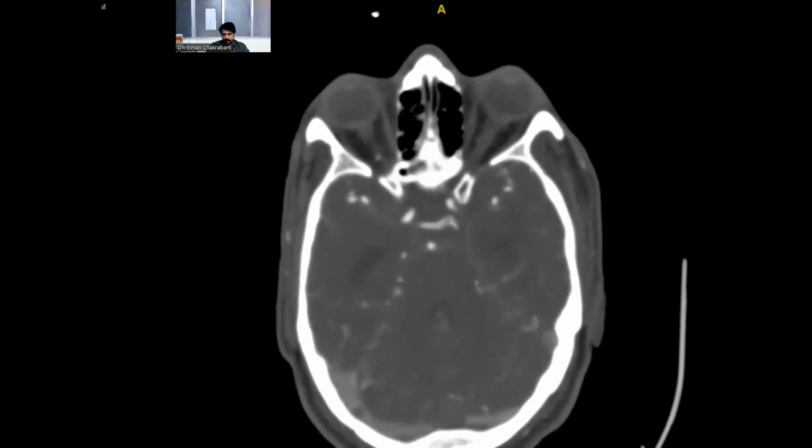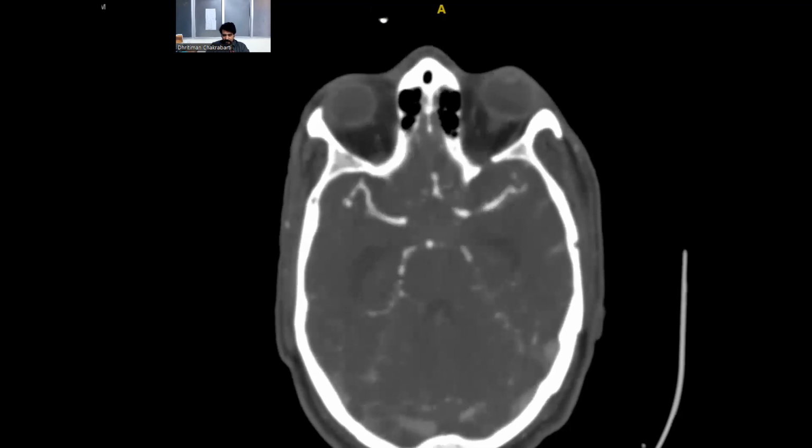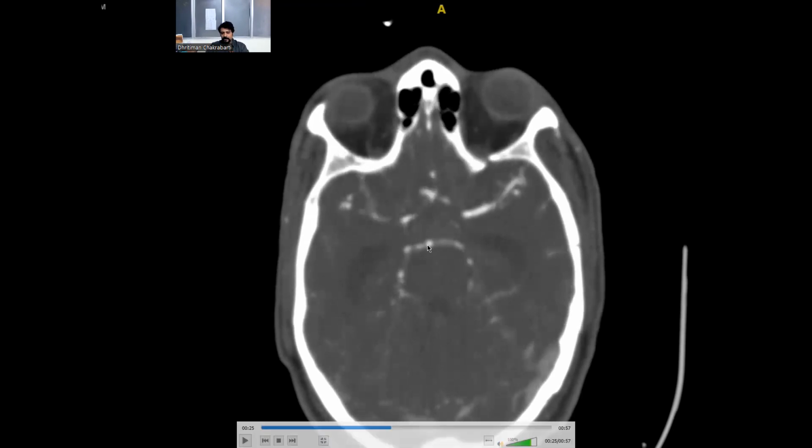All right. So we are about to reach the midbrain, and now you have reached the midbrain where you are able to see the PCAs. You are able to see the PCAs here after the splitting off, because the PCAs have split and come a little inferiorly. So you are able to see it in the lower cut. And superior to that, you can see how the basilar is splitting into the two PCAs. So this concludes your anatomy of the vertebral portion of the posterior circulation.